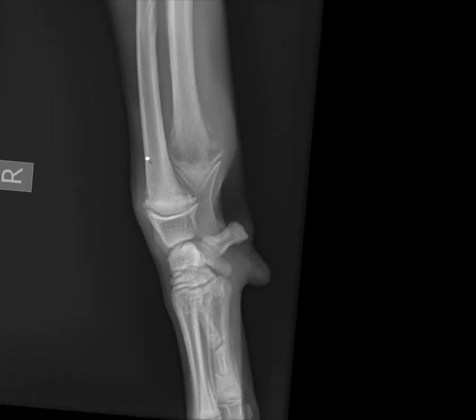When we're assessing C for cartilage in a juvenile, we also have the chance to assess the growth plate, or the physis itself. When I look at the metaphyseal region right next to the physis in this patient, I'm seeing increased opacity and a radiolucent band. On the ulna, you can see the radiolucent band is a much more prominent feature. There's also some periosteal reaction that extends along the metaphysis.